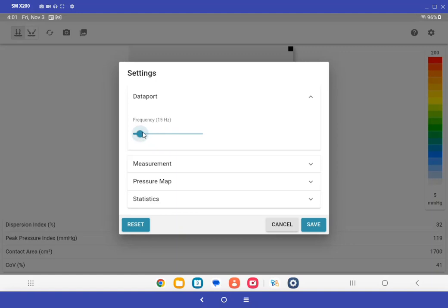It really depends on the device a little bit, but normally we say 15 to 20 hertz is usually quick enough to capture a person's movement in more or less real time. Your eye basically is 30 hertz, so anything above that you can't tell the difference. And this is really not meant to be a video recording system or a high-end research motion capture system. So 15 hertz is usually acceptable.